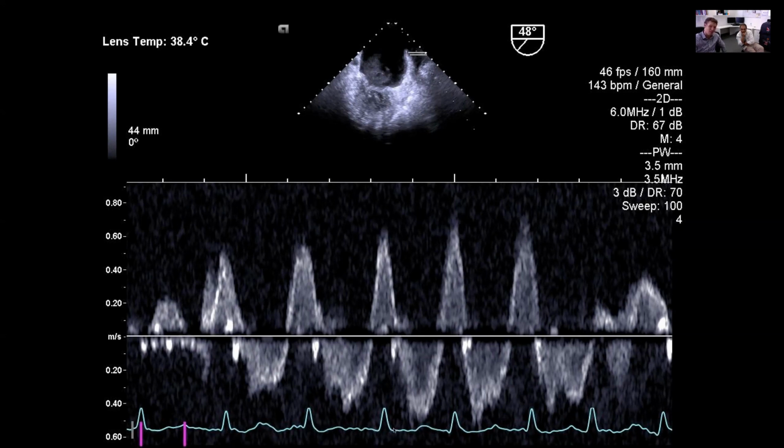Or the other one, because again, it's from the beginning of the QRS to the end of the T wave, the systole. So during the systole. Yes, it's systolic flow reversal. Because this is the D wave, this is the S wave, and this should be much bigger. Yes. In which case we're dealing with systolic flow reversal, which is suggestive of severity.